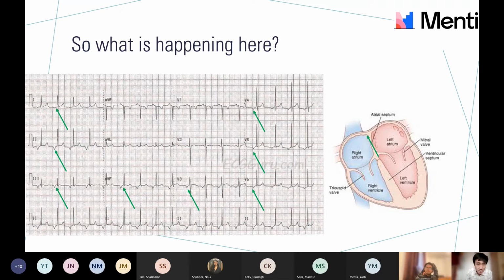But what it actually is suggesting is it's going in the opposite direction to what we expect, which is actually pointing at the pacemaker not being our sinoatrial node, but from the middle of the heart. Because what's happening is you have depolarization going down to the ventricles, which is giving us our normal QRS, but we've got depolarization going up the other way. Which is why our P waves are inverted, because we're going in the opposite direction to what we'd expect. So this is suggesting a junctional pacemaker, a pacemaker originating from the AVN. This is less of a knowledge point for SBAs, but it's just a useful thing to interpret in terms of visualizing what's going on from the ECG trace.